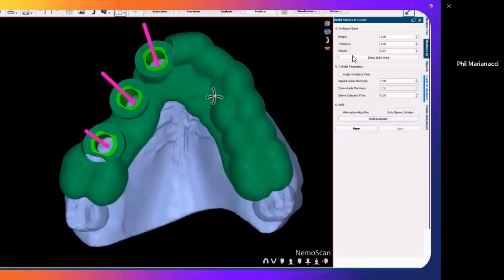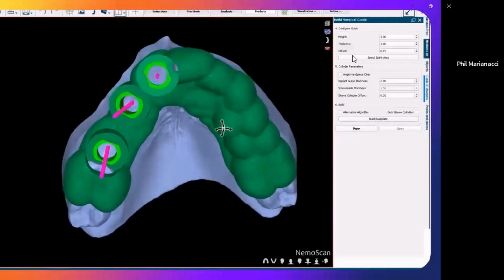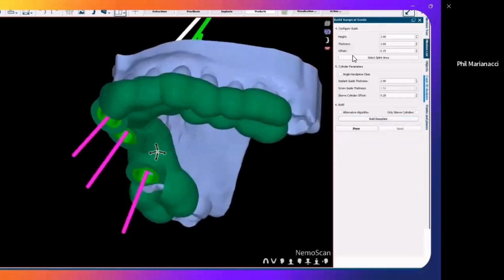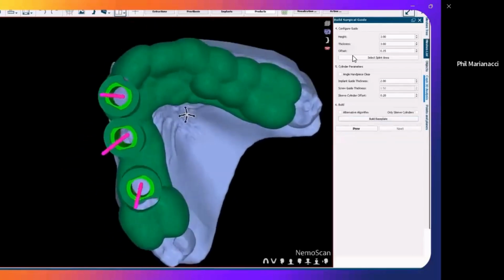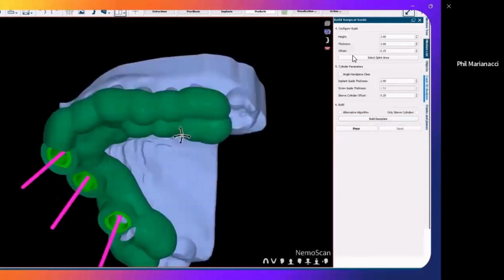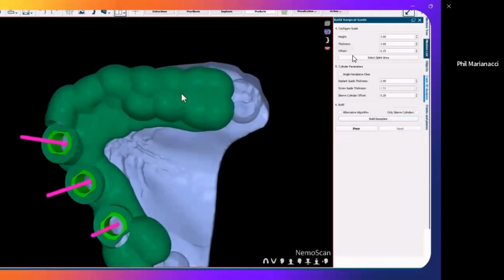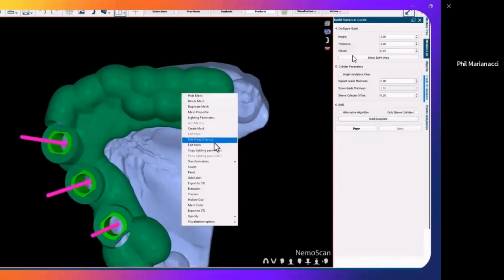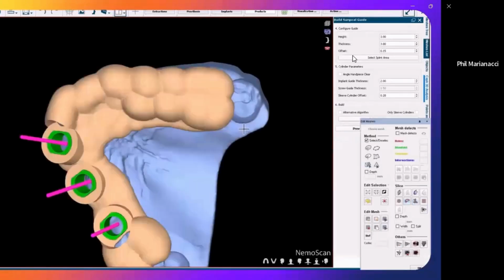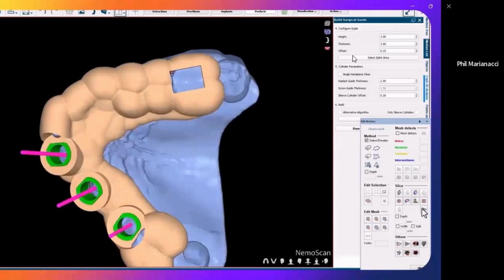And you can see that Nemo basically creates a surgical guide incorporating our guide sleeves into the plan. Lastly, at surgery, what we want to be able to do is ensure that this is properly seated. What I like to do is create a couple different viewing windows. We're going to use some tools to visualize that a little bit better. Basically, we're just going to punch some holes.